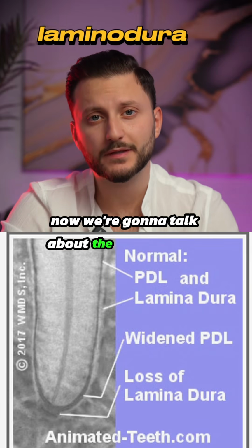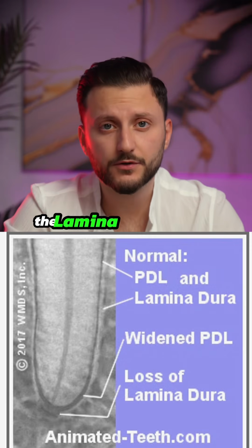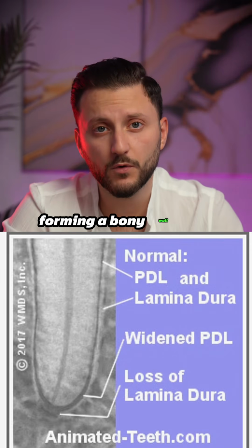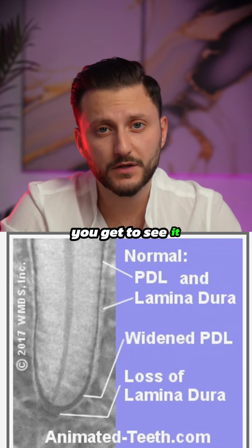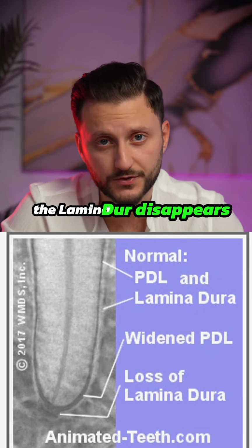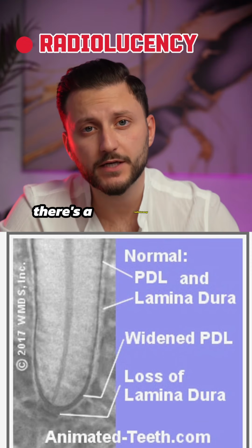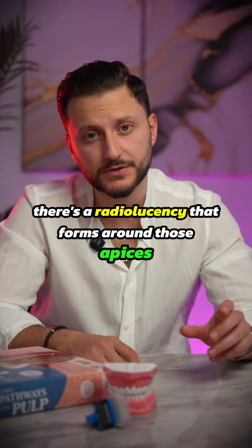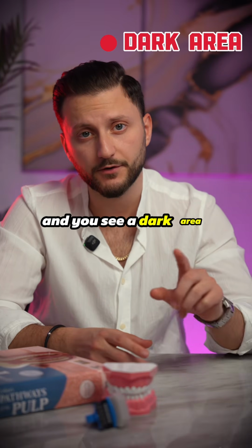Now we're going to talk about the lamina dura, which is the dense bone lining the tooth socket. The lamina dura surrounds the tooth socket, forming a bony wall that the PDL fibers attach to. And when there's an infection, you get to see the lamina dura disappears and the PDL actually becomes widened. Over time, there's a radiolucency that forms around those apices, which denotes that the infection is growing, and you see a dark area around it.